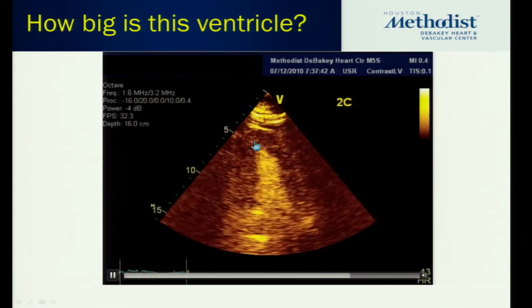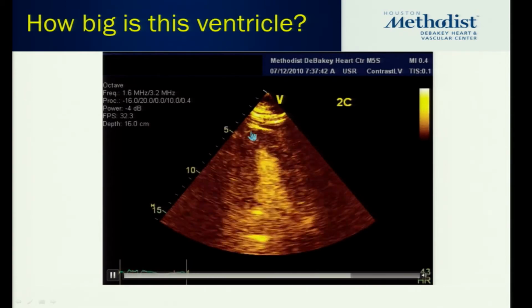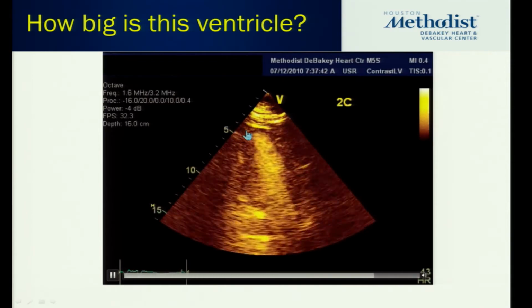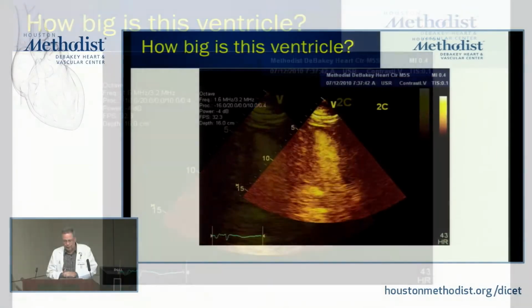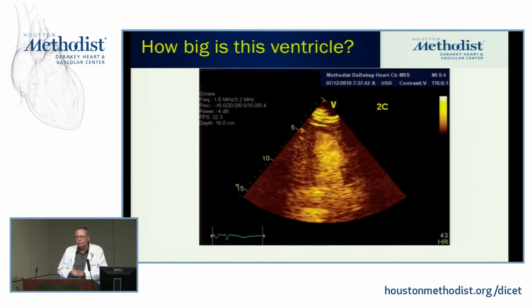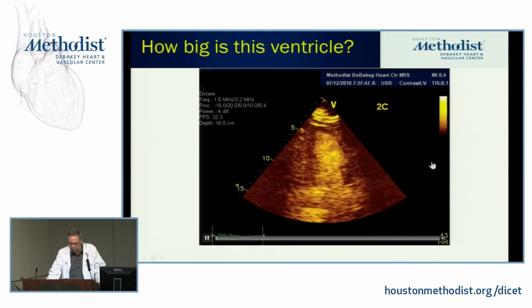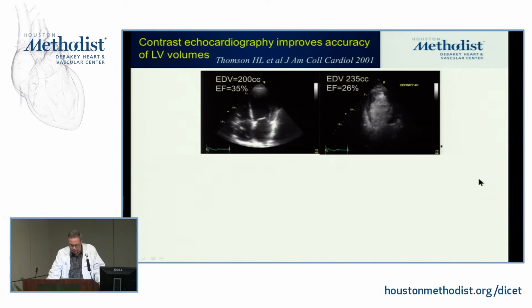In fact, there is a tiny, tiny little cavity created at end systole, and maybe the tip of the apex not contracting that well. I mean, you get to details that you get likewise with MRI. So contrast can often rescue a study and save you some money on doing other studies. And now you could clearly stop anytime and trace and do all your measurements.